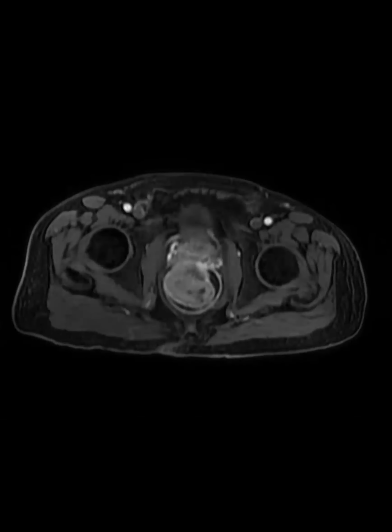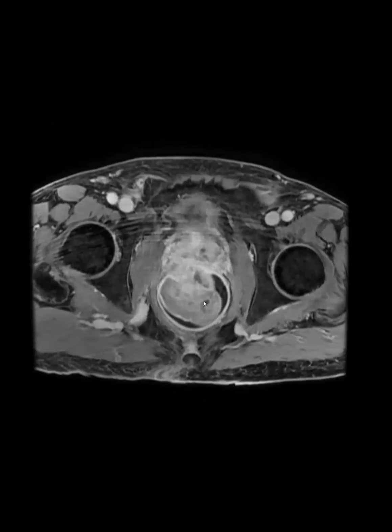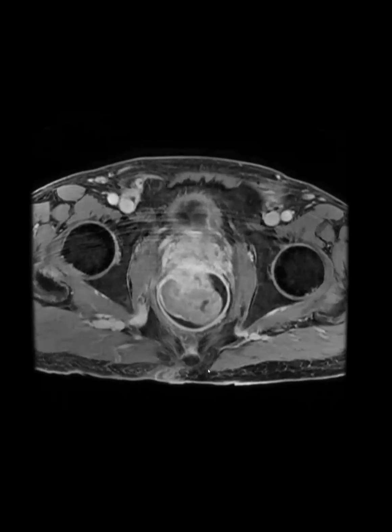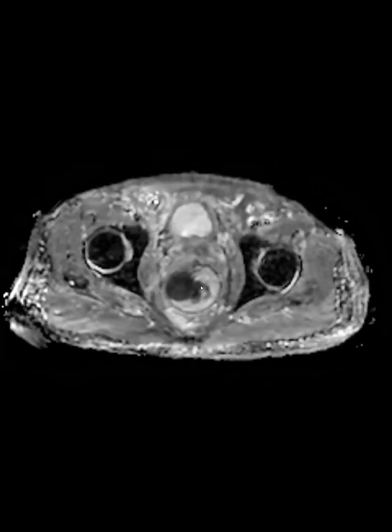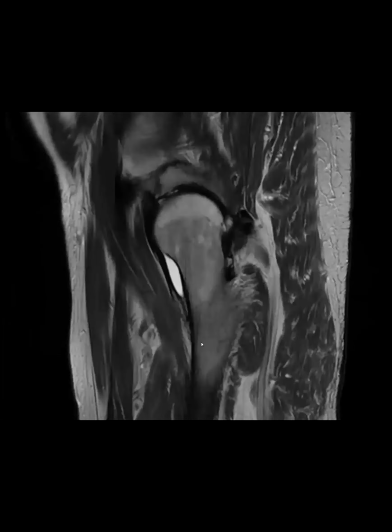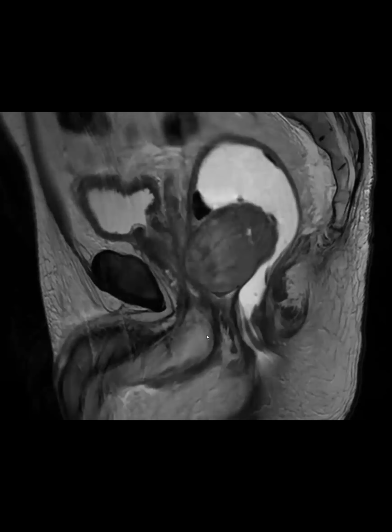That has more necrosis, or areas of non-enhancement. And it doesn't really enhance and wash out in the same way that the first one did, but maybe because it's just degenerating. So are you thinking rectal cancer? I mean, statistically, rectal cancer is still going to be the most common, but tissue is the issue, right? I don't think we can tell by MR. We can call it this or that.